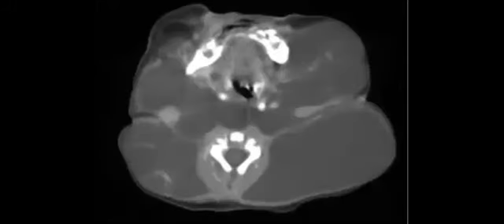When you see a big ugly mass in the head and neck, what is your differential? Cystic hygroma. Yes, perfect. It can be cystic hygroma. It can be what, Marwa? Yes, perfect, Sarah. Lymphatic malformation.